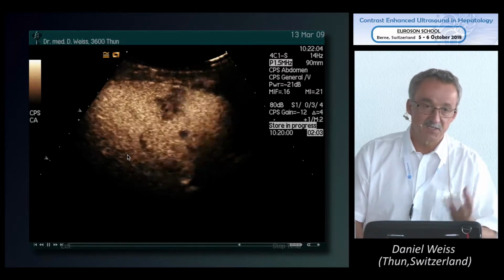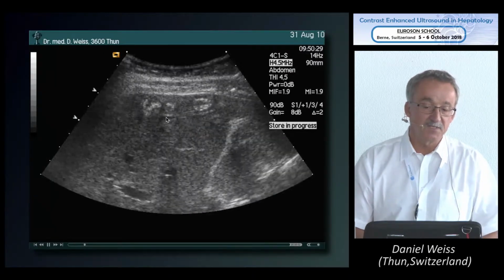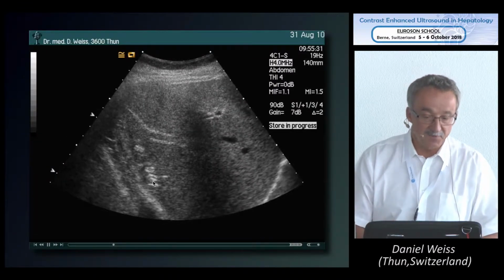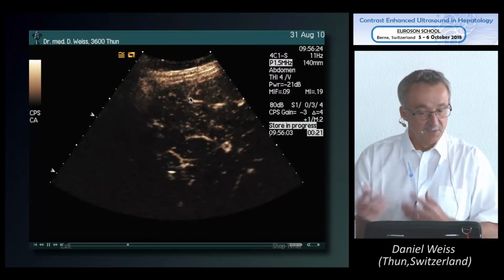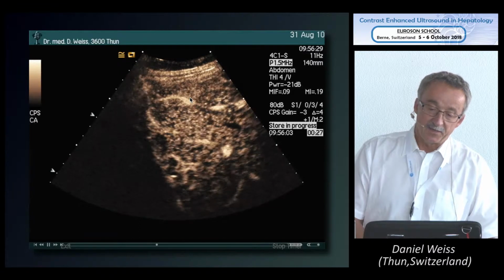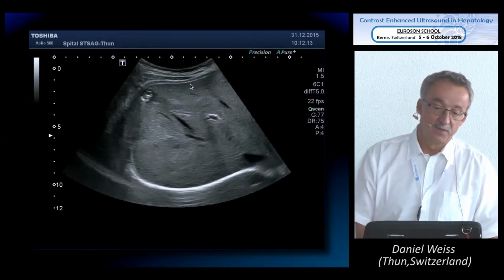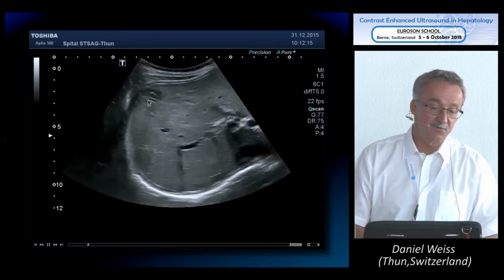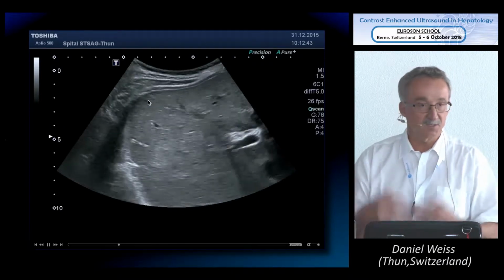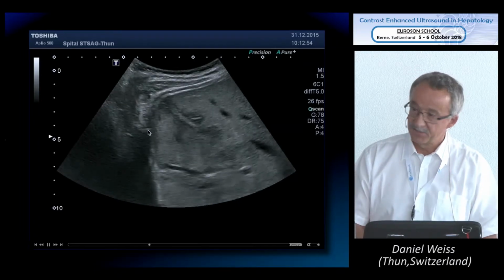So it's a lot of antigenic material around. And this is what you can see after a certain time. You just see calcifications. So when you treat it, you see several calcifications. So these small animals, they die, and you have calcifications of these tunnel systems, and especially of these animals. And in the end, you cannot say what it is. It's just a scar, just old hematoma, just an old parasitic disease. It looks like this after a certain time.